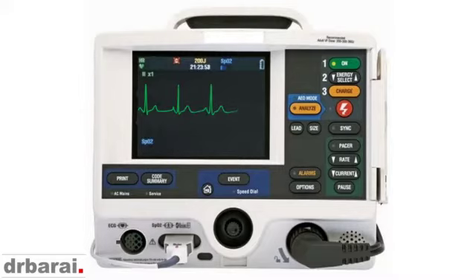These are reversible causes for cardiac arrest, and we need to take appropriate measures to give the best available care for these patients. So these are the 4 deadly causes of the ECG pattern or ECG rhythms that we should look for in a patient with collapse. Let me show you some of the other interesting ECG patterns which you might pick up.